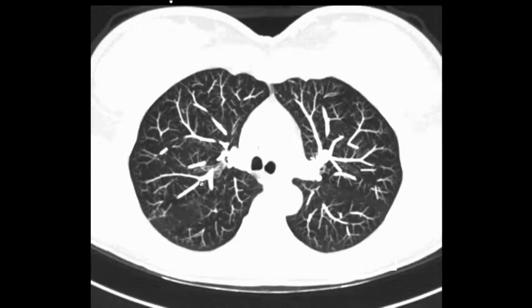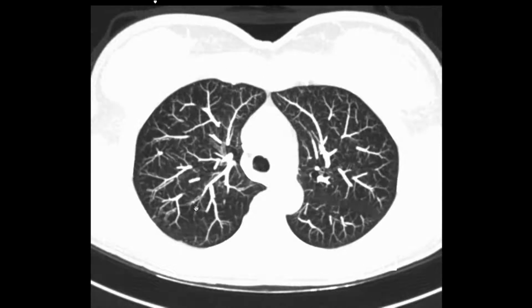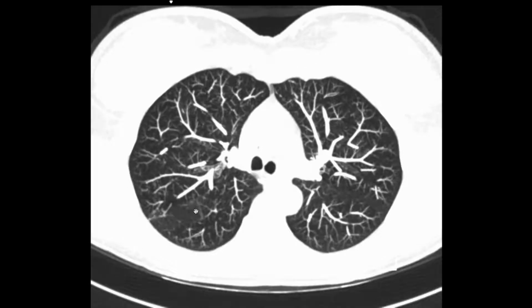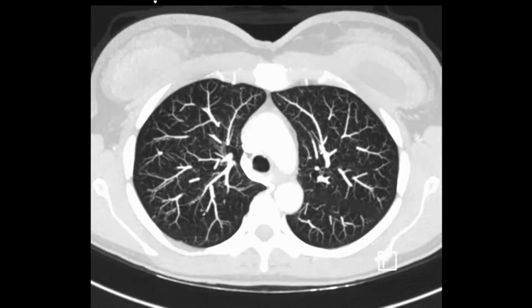Yeah, exactly. So one of our pulmonologists here, and if Mark Schiebler is there with Jeff, he knows very well, is quantifying mucus based on number of airways and segments that are plugged like this. So we're actually doing research, going through and counting these plugged airways, like you're saying, Howard, and looking for things paralleling the arteries is a very good, easy way to find them. So they're very common in asthmatics too.